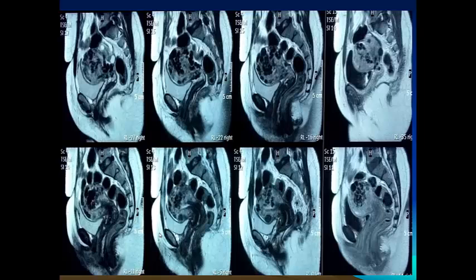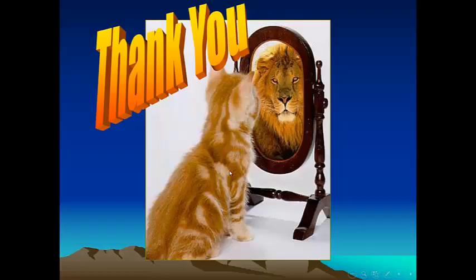Then we came to some entities that are better seen by MRI, like the AVM. This is uterine AVM with large arcuate vessels, large feeding arcuate vessels, small fibroid here. So this is the appearance, tubular signal void, the typical appearance of the AVM.